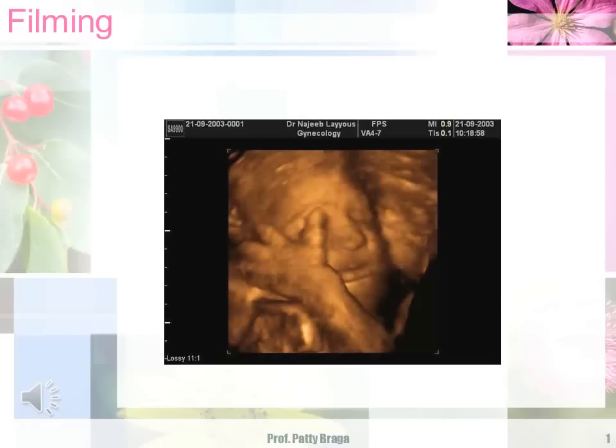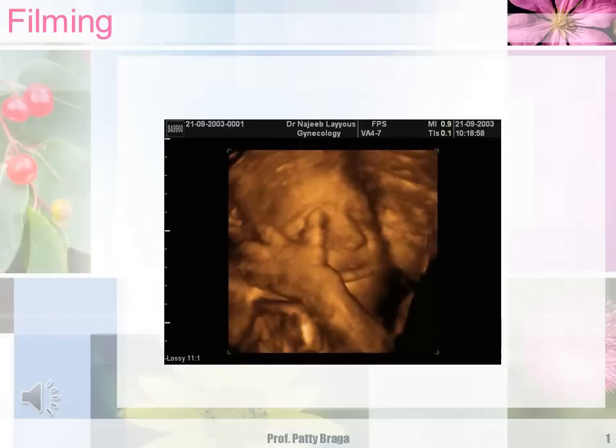So this is a 3D image, which is a newer technology for us and one that is still on the rise as far as the multiple ways that it can be used. Right now, most people associate it with fetal ultrasound and being able to see the babies in 3D, which does have great advantages. People can become very creative with their ultrasounds, which you'll see in the next slide, and even inspired from their ultrasound, which you'll see in the slide after that.